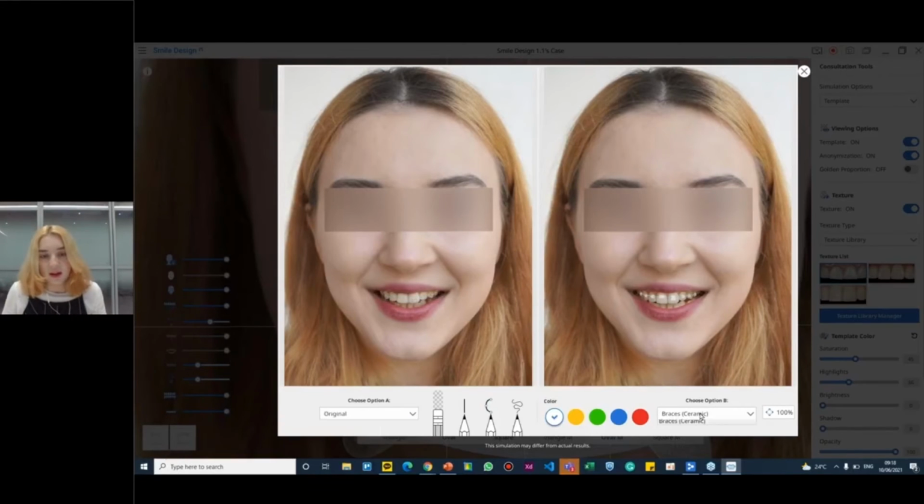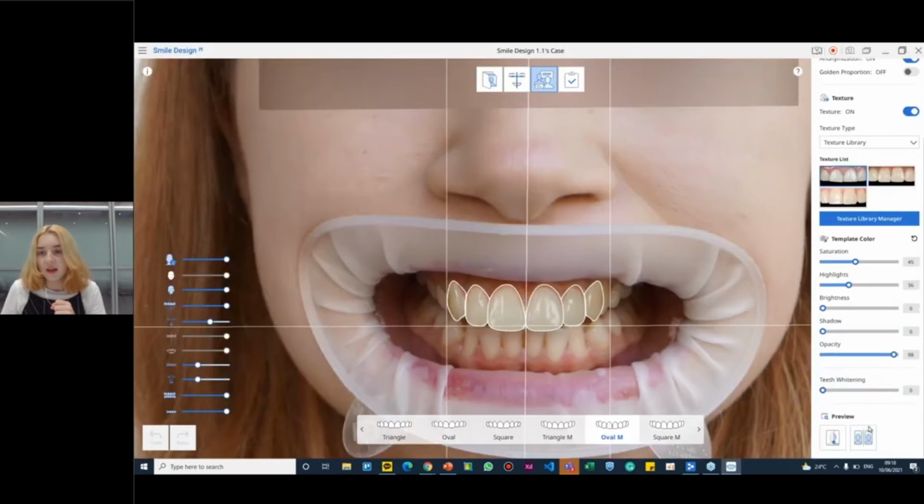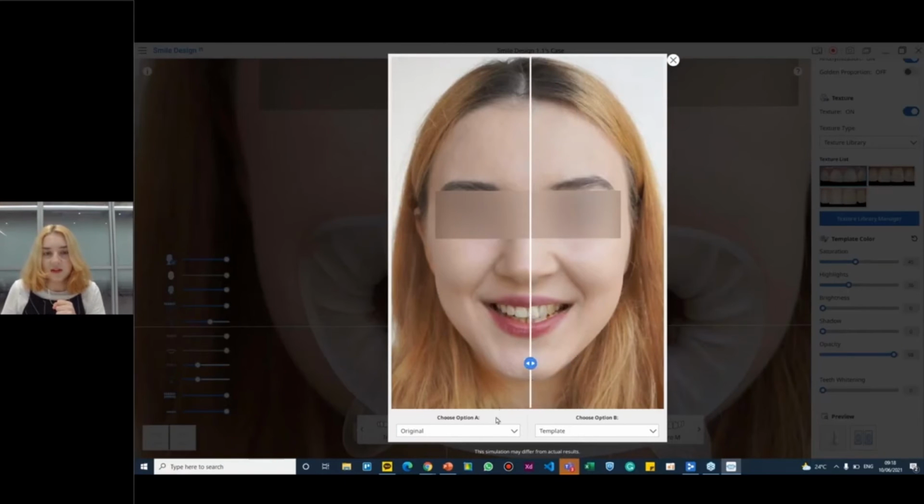And then as well, we can compare before and after. This is one way. And you can also use this option. Kind of a side by side or like a toggle bar that you can move across to see the difference. Yeah. I like that.